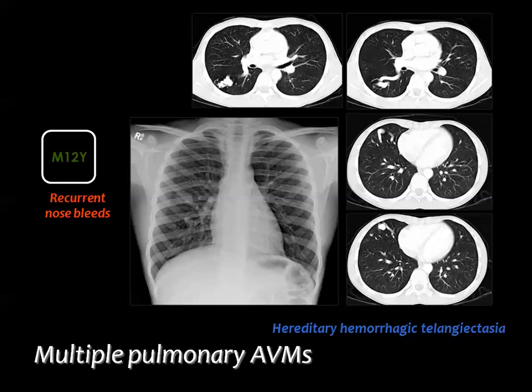It is better to see the arterial and the venous drainage, two cords, but if you see only one, this is enough for the diagnosis of arteriovenous malformation, because the second cord may not be shown in the same section. It may appear in the previous or the next section.